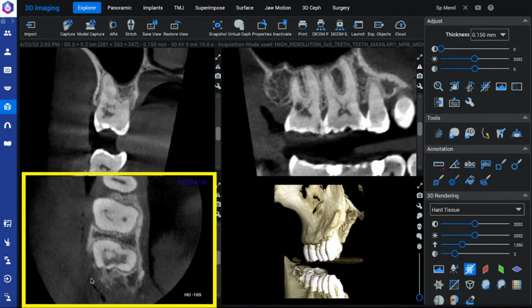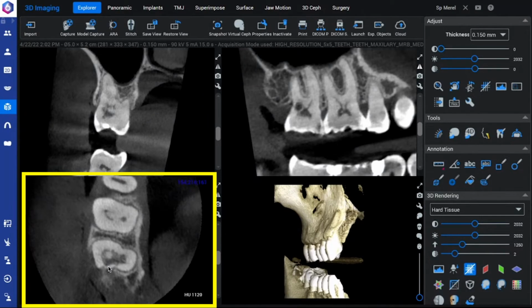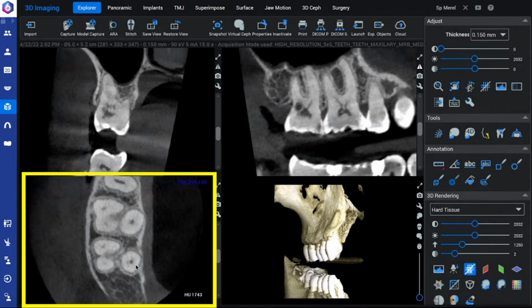In the bottom cross-sectional view, we can see that as we look at the tooth further down, traveling apically, the resorption defect had started in the cervical area here, is really extensive into the tooth here, and then travels down, unfortunately, the palatal root. So we can see here all that moth-eaten, fuzzy look. We can see that protective sheath. We can see the moth-eaten, fuzzy radiolucencies. That tells me it's quite far down the palatal. In fact, it keeps going as I scroll down.